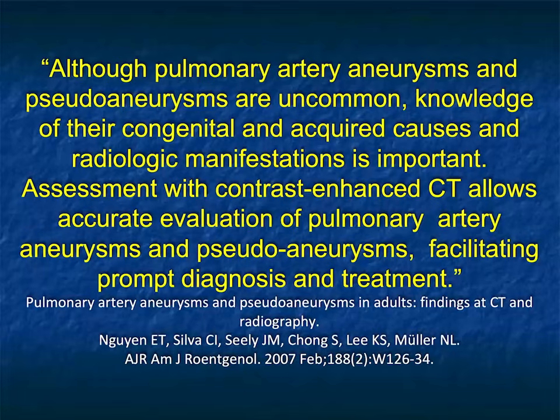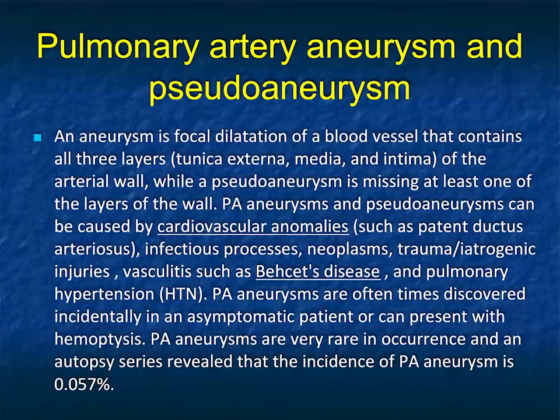In this article by Nugent, although pulmonary artery aneurysms and pseudoaneurysms are uncommon, knowledge of their congenital and acquired causes and radiologic manifestations is important. Assessment with contrast-enhanced CT allows the accurate evaluation of pulmonary artery aneurysms and pseudoaneurysms, facilitating prompt diagnosis and treatment. And again, complications of these aneurysms and pseudoaneurysms can be rupture and bleed, so the early diagnosis indeed becomes very, very important.